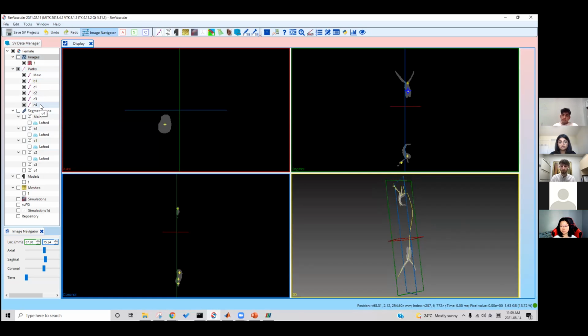Each path represents a single vessel. So even though these vessels will intersect, you want to do each single tube as one path, and you're going to combine them later. So now I will show you guys how to actually get this very nice looking path through the model.